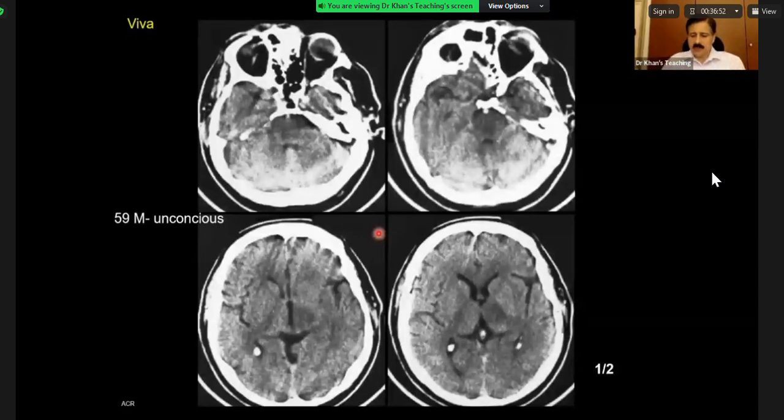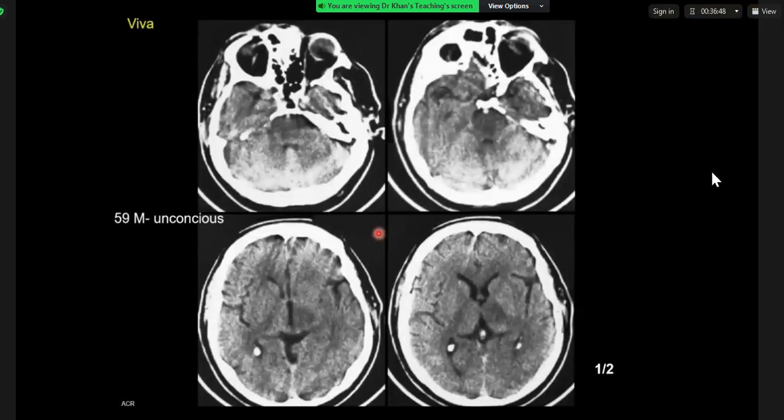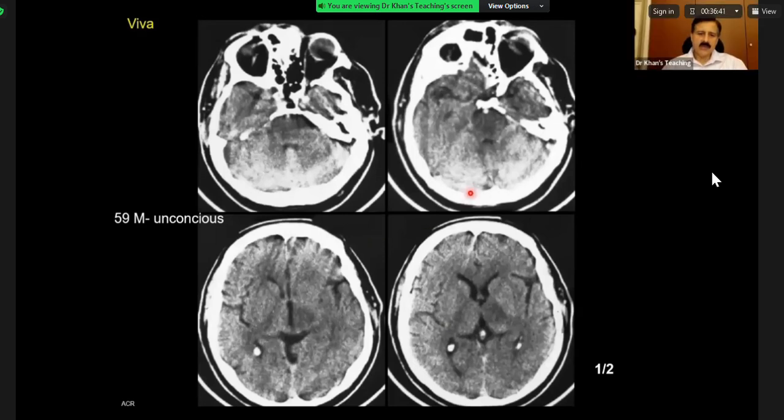This is your last case. Sure. Unconscious patient. So I can see a dense basilar tip, in keeping with basilar thrombus. Excellent. Now, if you see here, the basilar artery is your friend. It should be one of your checkpoints for the exam. Look at one of the review areas, basilar artery.